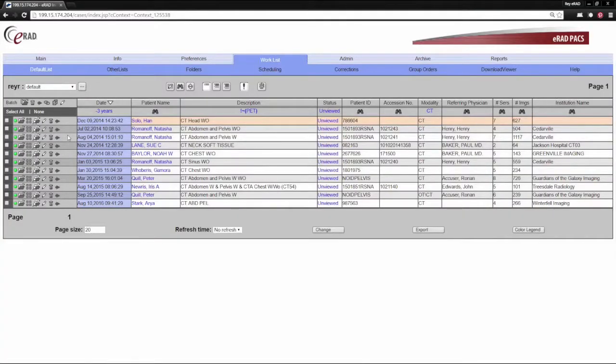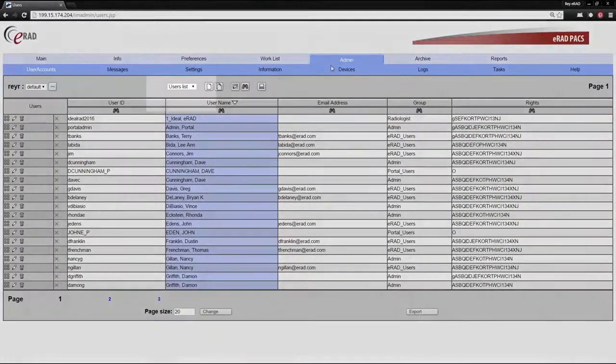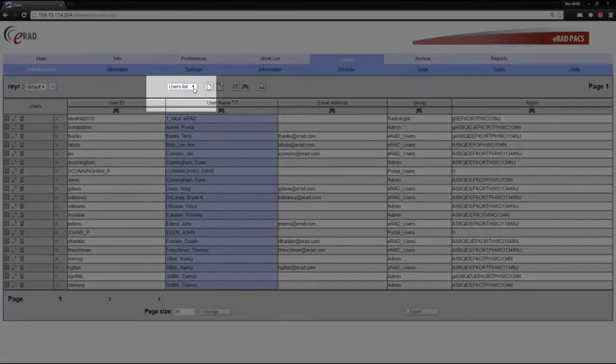Creating and managing groups is a great way for administrators to control the granting and revoking of user permissions, distributing shared work lists, and controlling study level access with global restrictions. To access the group's configuration page, click on the admin section from the top menu and select Groups List from the drop-down menu shown here.